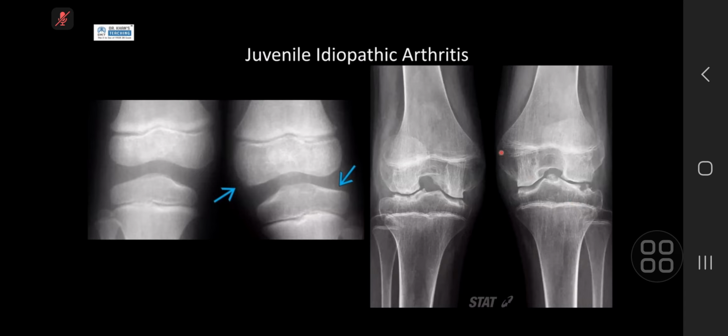This patient has these long gracile bones, flaring of the metaphyses and epiphyses with osteopenia, erosions, and joint space narrowing. So remember, in inflammatory pathologies, even in kids, your joint space narrowing is diffuse because the joint is coated by inflamed synovium, versus in an older patient where osteoarthritis is quite focal because it's in the weight-bearing aspects. So inflammatory diseases affecting the joints often give you diffuse joint space narrowing and not focal. Okay.